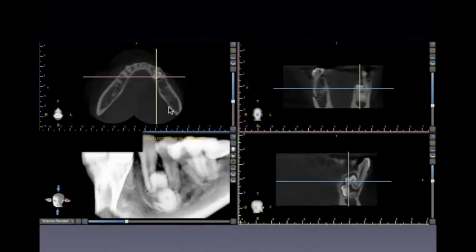Okay. Another particular example that I have was that of a patient wherein two-dimensional image seems to have, according to those that referred, an odontoma on the apices. Now, not going into diagnosing pathology, but looking at since two-dimensional image showed an amorphous looking solid object as radiodense as that of tooth, one may think that it might be a complex odontoma.